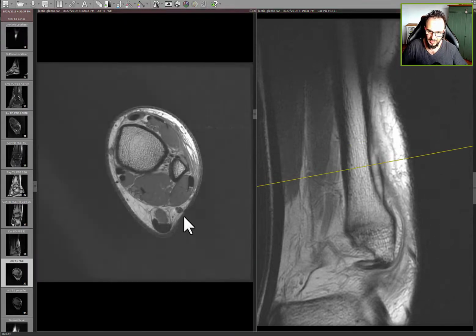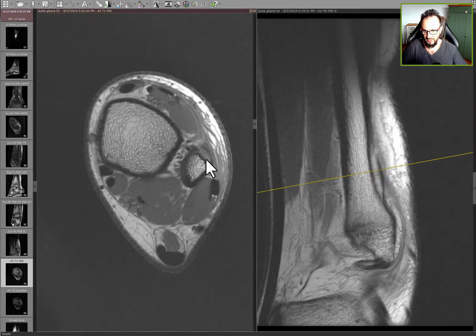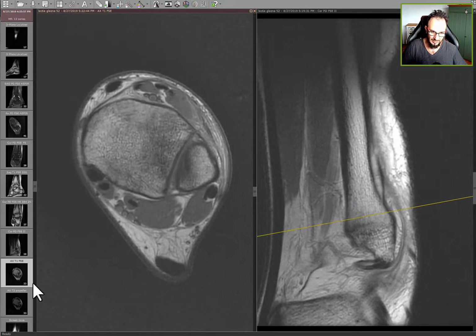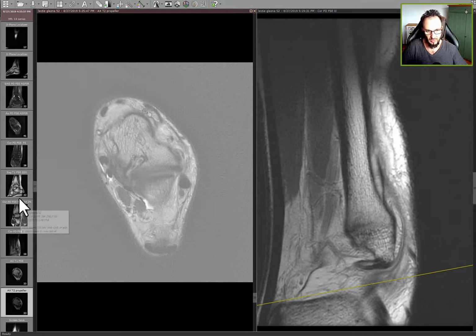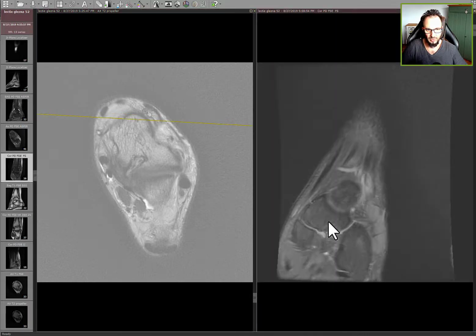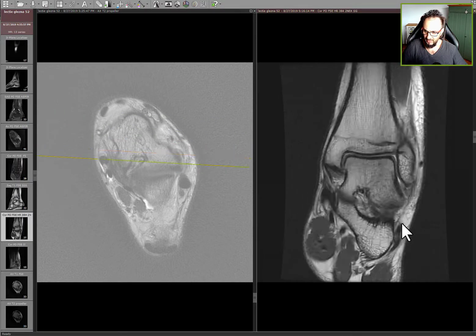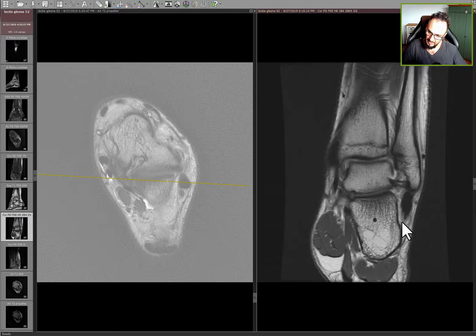I also have axial T1, which shows this fluid here, which is a bit bright, so it confirms that there is blood in it. Axial T2, the same findings. I want to see a better coronal PD with FATSAT, and I do not have one, so maybe we'll see on this one. Are we looking for the fibulo-calcanean ligament, which is here like a hammock?